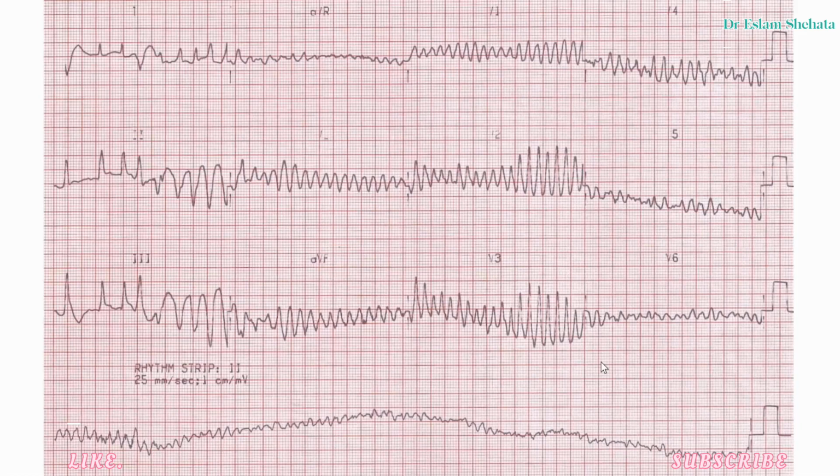And so this is called Torsades de Pointes VT, which translates to twisting of the points. And the underlying cause, I suppose, is that the ventricular tachycardia in this case is not driven from a single pacemaker. The origin of each beat is rotating through the ventricles, and so the axis rotates with it as each QRS complex originates from a slightly different position in the ventricles.